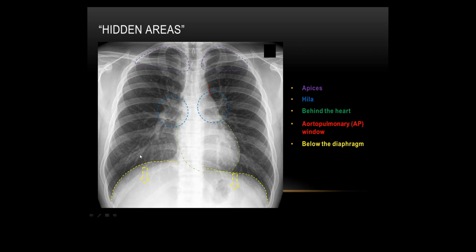Basically, it's where you've got the fibrous sheet of your diaphragm, and then around it you've got all your muscles and your muscle slips. What happens is your muscles tend to protrude up like that in some patients, so you get this slip of the diaphragm. So that chest X-ray was reported as probably just eventration.